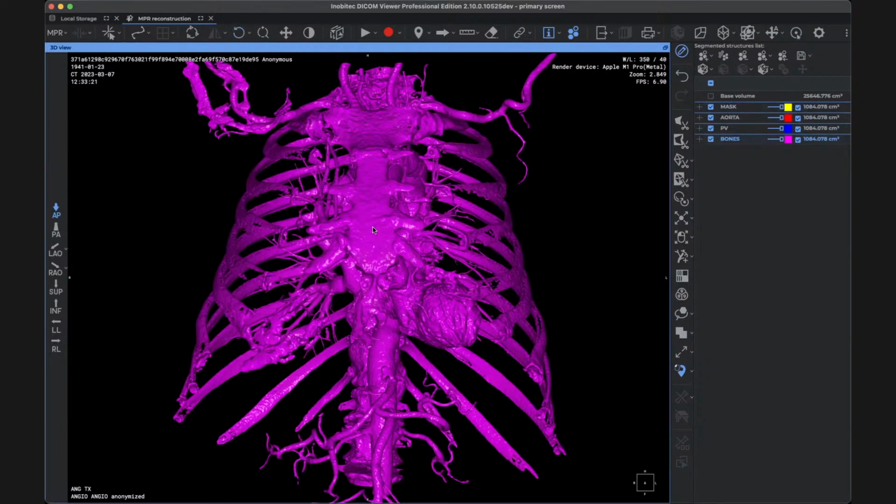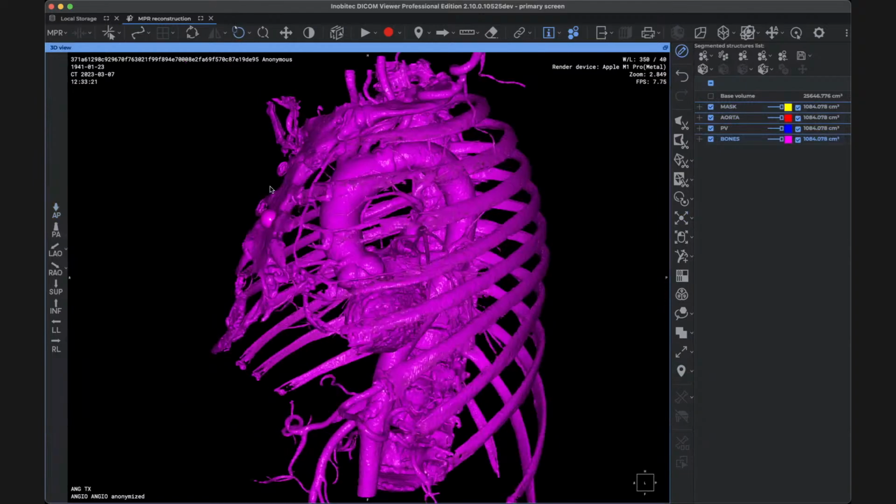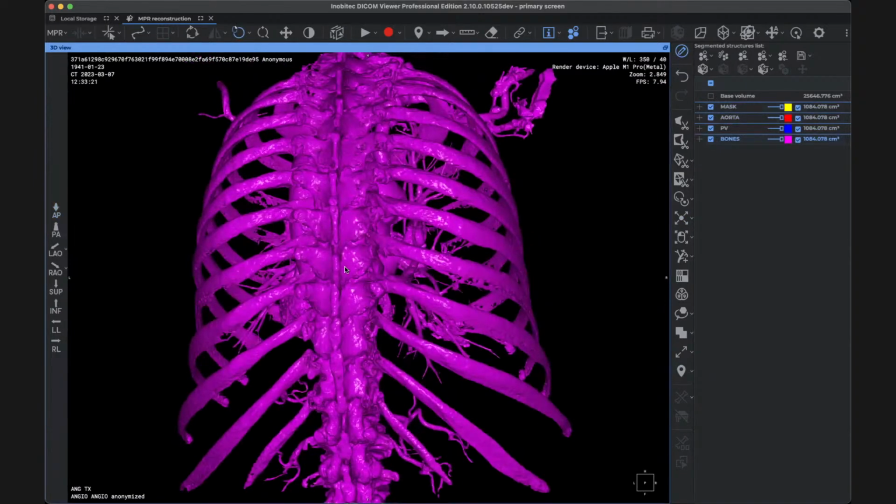Select the markers here, one marker here. One thing I like to do is that we can change the size of the markers. So with only one marker, you can grab more structures. I'm gonna put 15 here, and I'm gonna rotate it with 3D view and put one more here in the spine.